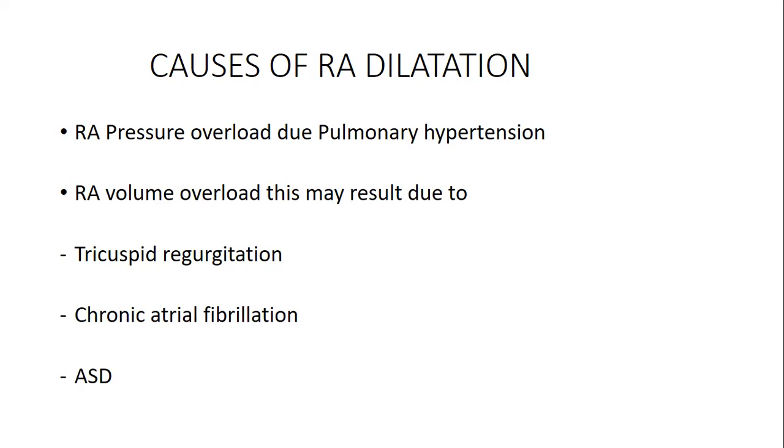So basically what I'm trying to emphasize is that you look for specific causes of right atrial dilatation that may actually help you to diagnose that this is what is happening on this side and this is what is not happening on this side.